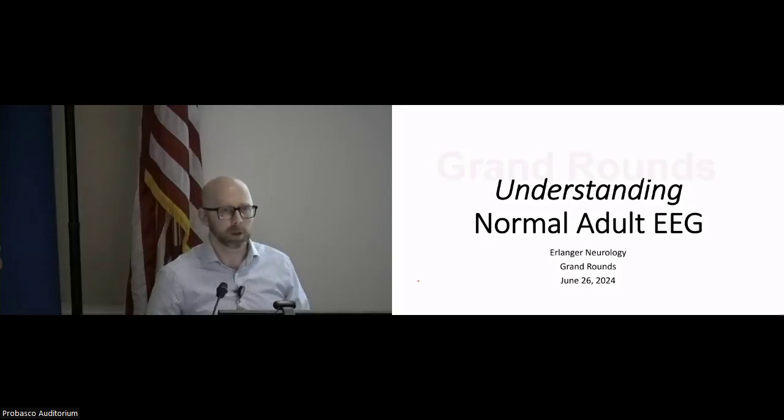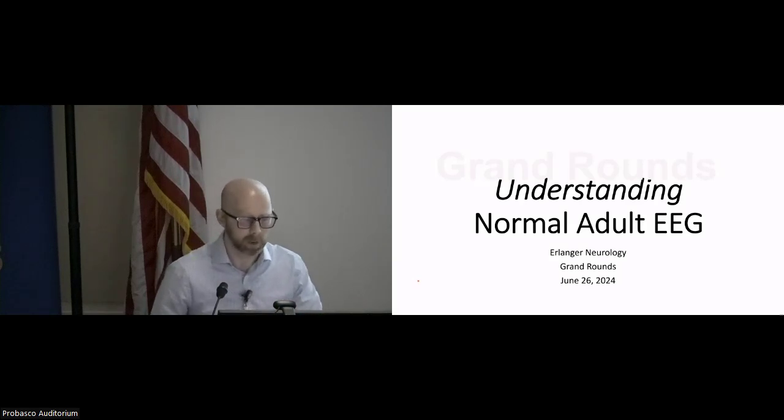Why does this artifact occur? And so that's the focus, to just show you a little bit of an overview of normal adult EEG. This is relevant, I think, to most people's practice, to at least know this part about EEG. What are you really even ordering when you order the test, and what goes into it?